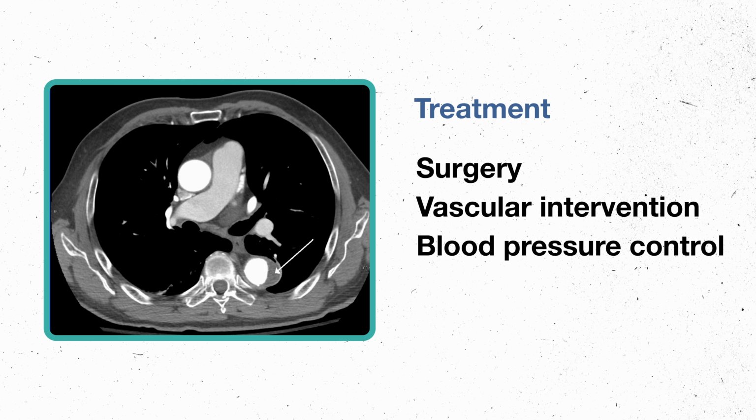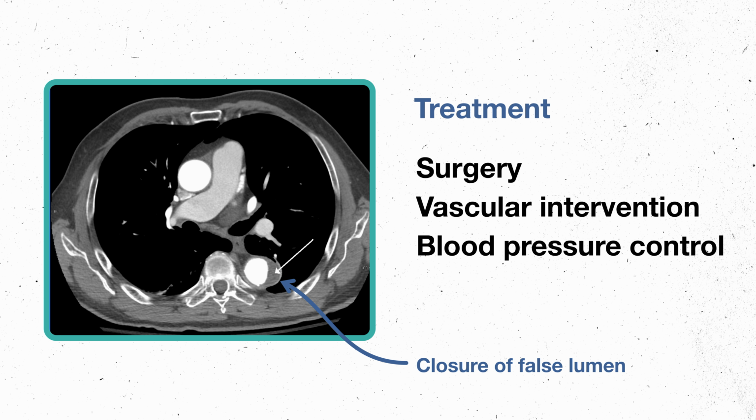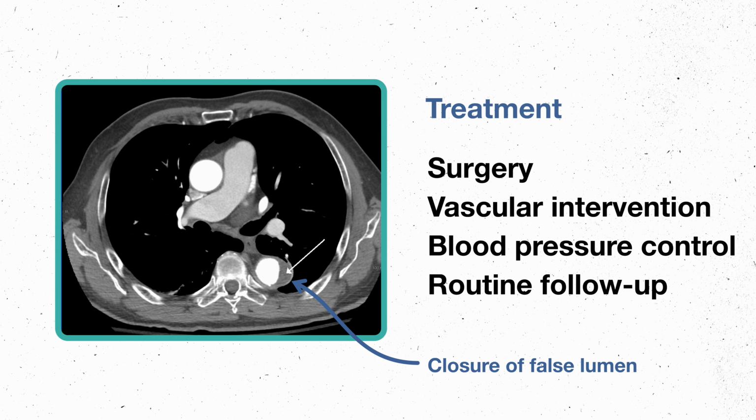With treatment, the false lumen closes, as you can see here in this image, and the patient should be followed closely with routine diagnostic imaging, particularly in the first 2 years post-dissection.